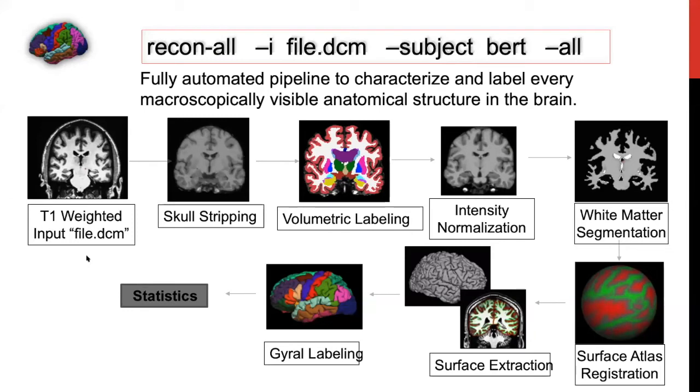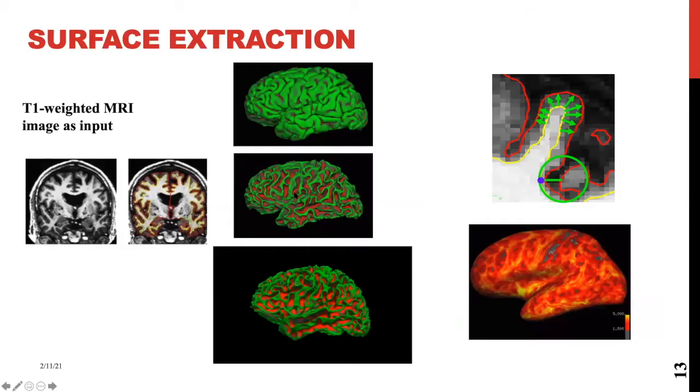Going back to this slide, it starts here, and then it generates the pial surface based on that white matter surface. That's going to be an important point when it comes to troubleshooting, or when you're trying to fix a bad recon, is making sure that you're making appropriate edits where they need to be edited, so that FreeSurfer can regenerate those areas as applicable.